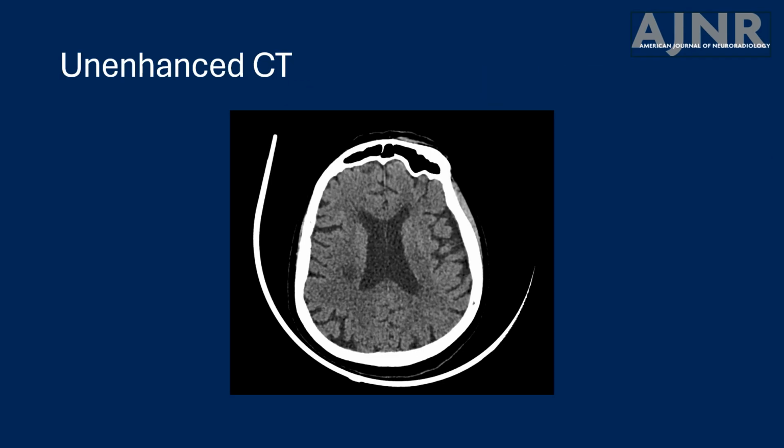Here we have a non-contrast CT. This is the first line imaging due to its rapid availability, though it may appear normal in the acute phase. I invite you to take a look at it and see if you can notice any changes.